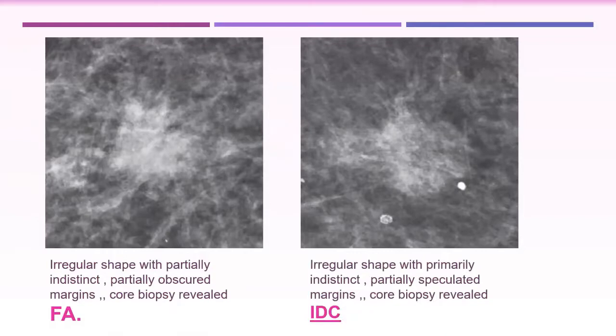If we go back, then again we recommend biopsy, because definitely we cannot differentiate, we cannot guarantee these lesions unless having stability over years. Okay, we cannot say this is hyalinized fibroadenoma and just leave it.